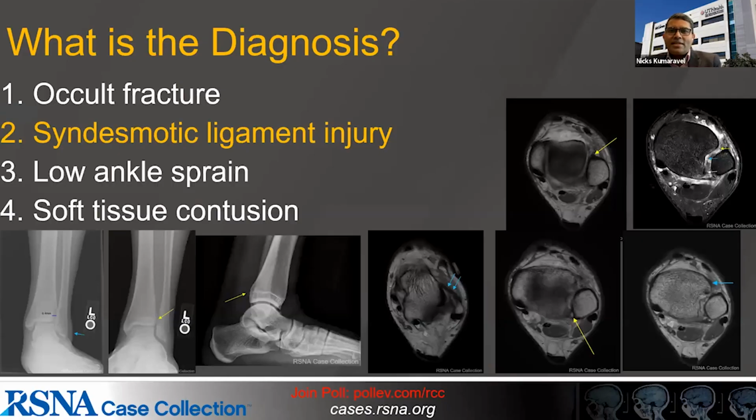And so this is definitely a syndesmotic ligament injury. Kudos to everybody who got it right. The majority of the people got it right over there. So what are we looking for? Just to go to the next slide again, please.